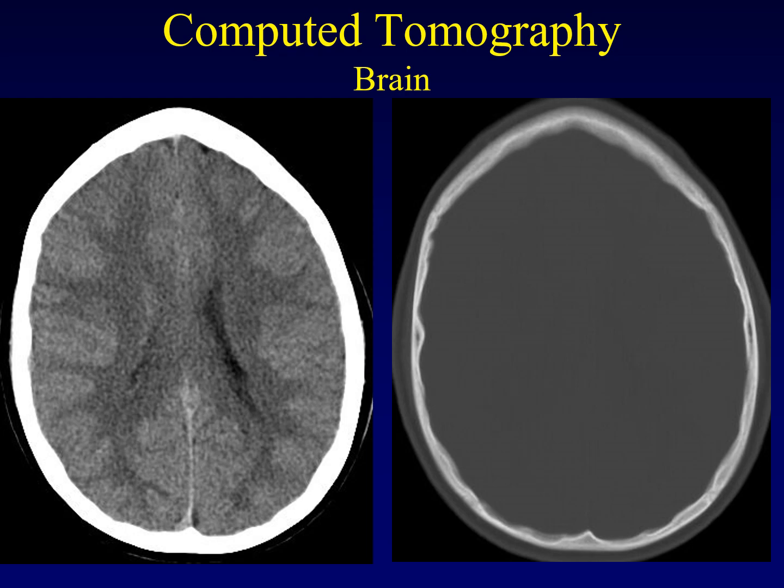So instead, we narrow down and look at just a window of possibilities. Everything that is below that in value, we plot as black. Everything that is above that in value, we plot as white. For example, when we want to look at the brain parenchyma and distinguish the subtle differences between gray and white matter, which can be made out on CT, we want to use a very narrow window and focus in on a very narrow range of possibilities. What this means is that we lose all ability to look at the skull itself. The skull is just a vague white blob.